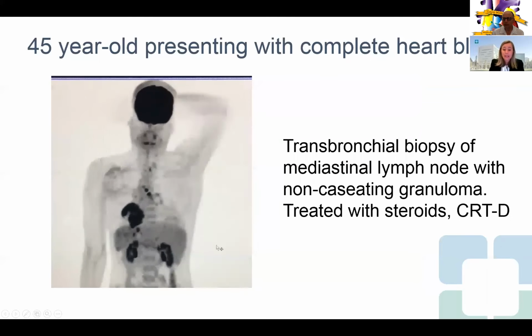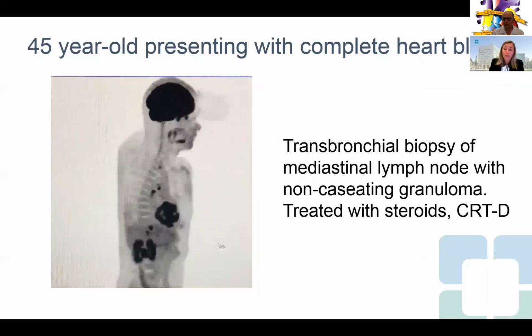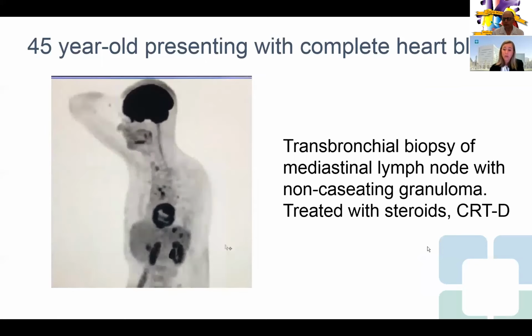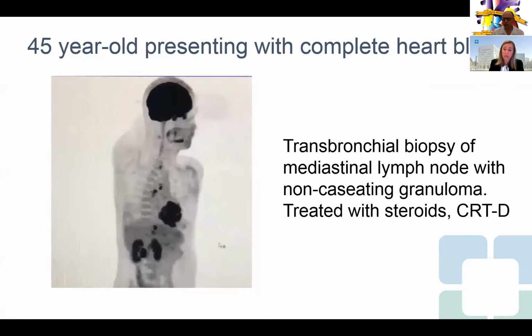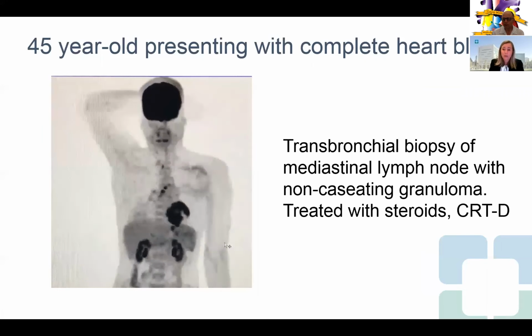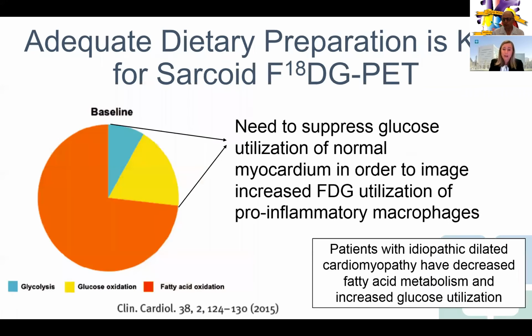You can see here that on whole body PET, he's got increased uptake in the lymph nodes, which enabled us to biopsy these and diagnose the patient with non-caseating granuloma. He was treated with steroids, ended up having CRTD, and did extremely well. So I think that's a nice illustrative case. A shout out to the importance of dietary preparation for sarcoid PET.